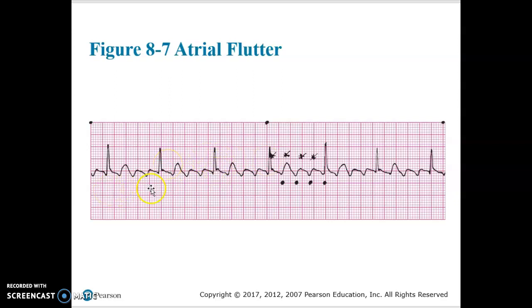But the atrial rate: I've got a QRS. You can tell you've got the T here. And then we've got P, QRS. Our T, again, looks the same. So our T's look the same across the board. But then what do we have here? We have oddball-looking P waves. We've got multiple P waves, and they're pointed backwards. These all flow the same. So that tells you that that's that flutter wave. That's that sawtooth pattern that you see.